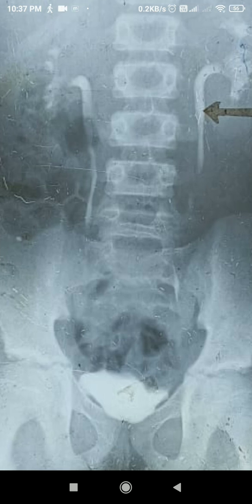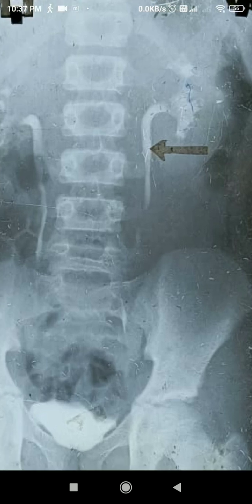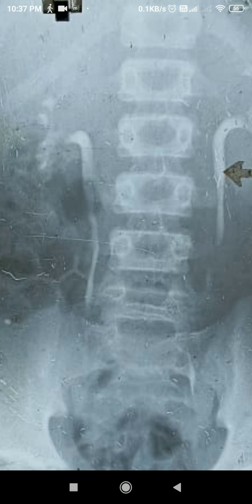That is one thing. The second thing is the dye is injected into the vein, and from there it is filtered through the glomerulus of the nephron, and we can see here the minor and major calyces, the pelvis of the ureter, the ureter coinciding with the tip of the transverse process of the lumbar vertebra, crossing the sacroiliac joints, and then ending up in the urinary bladder, which is there in the anterior pelvic wall.